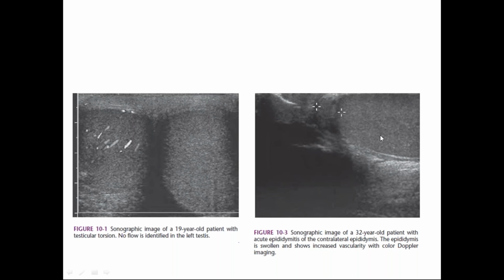And this is another image with acute epididymitis, where we can see increased size of the epididymis and increased vascularity with color Doppler imaging.